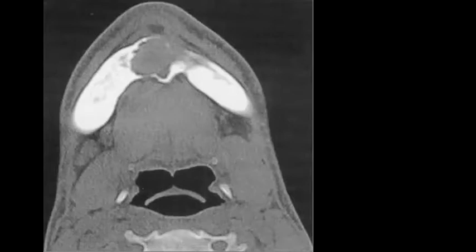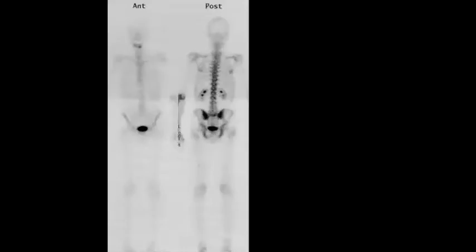Let's go further. This patient did this study, which is a whole body bone scan, MDP.